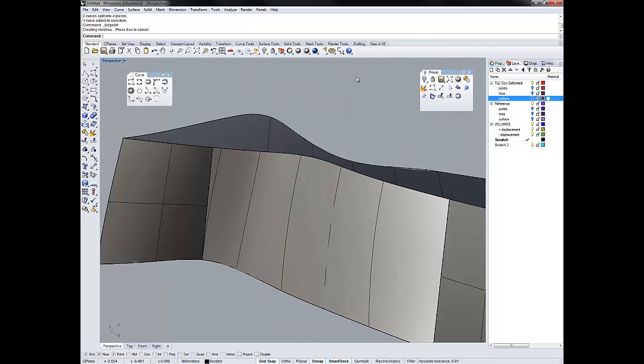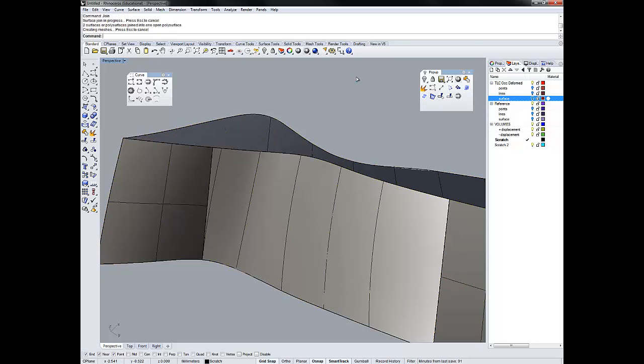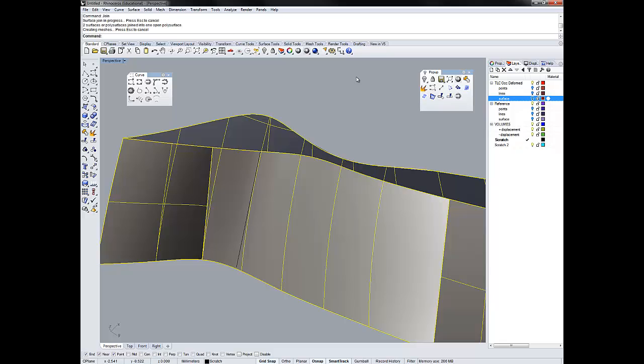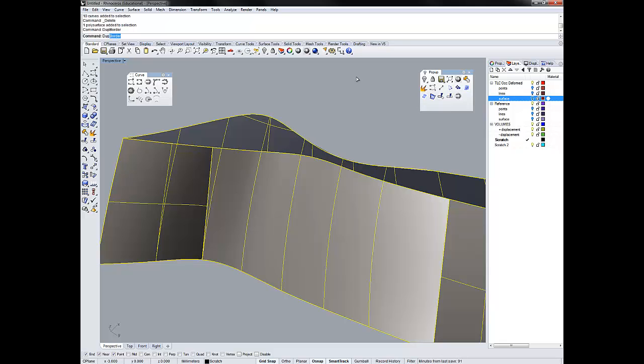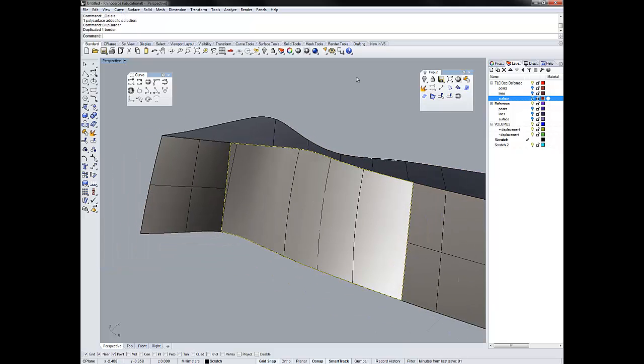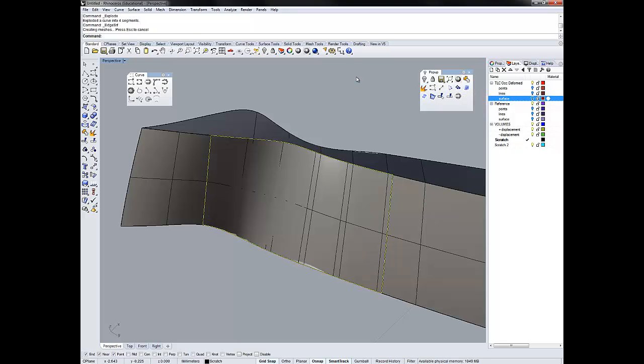And so again, what I'm going to do is I'm going to select my new surface, select my poly surface, join, and I'm watching to see that it actually says successfully joined, because sometimes it will not. And that's when you have problems that you need to troubleshoot. So I'm going to again invert, delete all my curves. I'm going to duplicate my borders again, and here we have these. And then I'm going to explode these into 4 segments, and I'm going to then select surface from 2, 3, or 4 surfaces. And here I definitely have some geometric inconsistency.